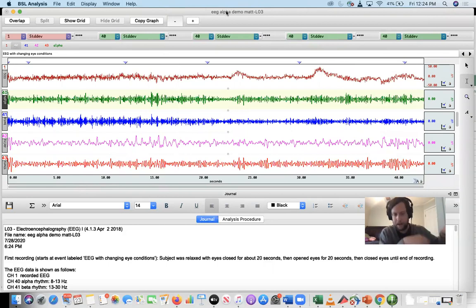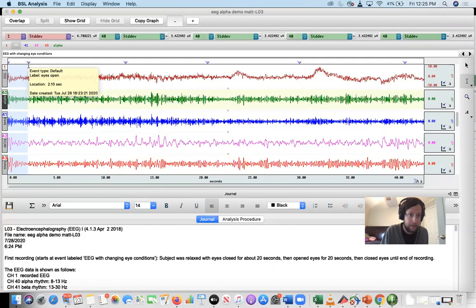This is a data file that I recorded even before the other one. But it's similarly structured. A couple differences though. The runtime at the beginning is shorter. Within like a second or two, that's when I opened, so my eyes were closed here. And then very soon after I started recording the EEG, that's when I pressed the first marker, which is when the eyes were opened. So this eyes open trial is right here.